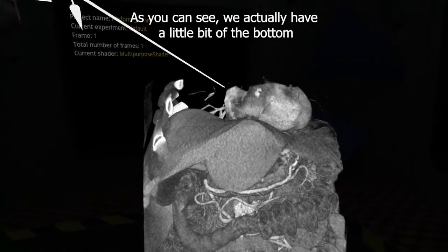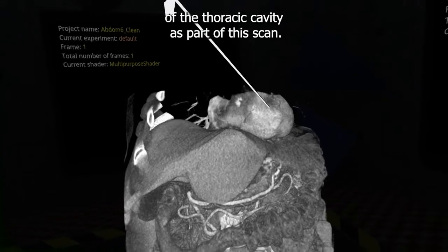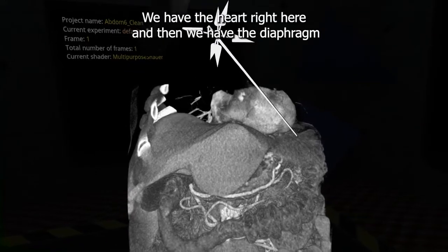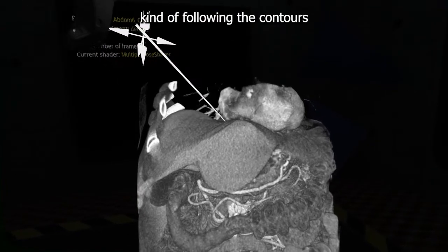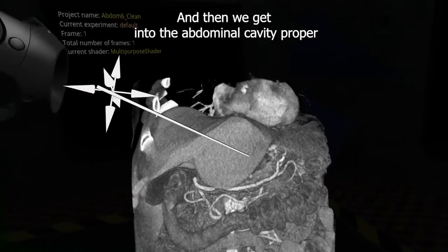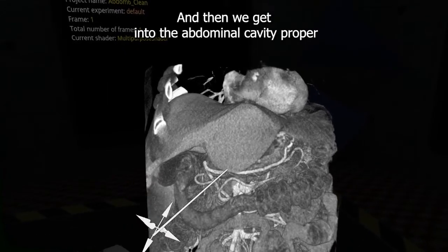I am here to take you through a quick tour of this digestive data set that we've got here. As you can see, we actually have a little bit of the bottom of the thoracic cavity as part of this scan. We have the heart right here, and then we have the diaphragm, following the contours of those underlying digestive organs. And then we get into the abdominal cavity proper.